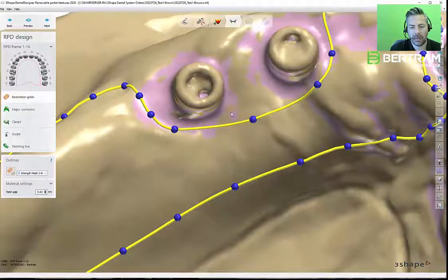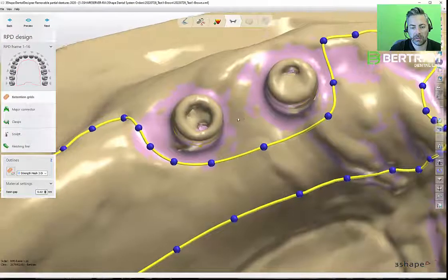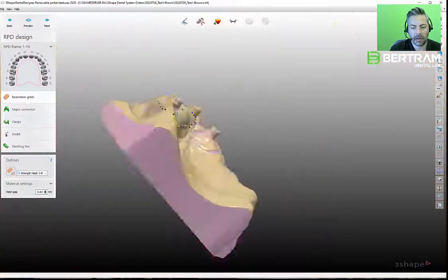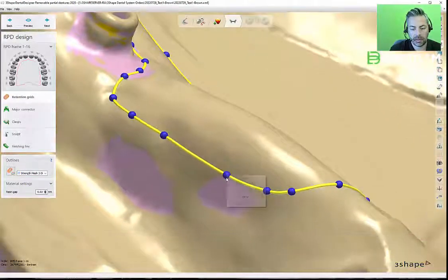One tip I would add here, this spacing is pretty narrow. I could try to get this meshwork up in here, but I know that is going to affect the layout and the spacing of the holes when they try to apply. So there's a different workaround that I'll do there, and I will show you that in a minute.